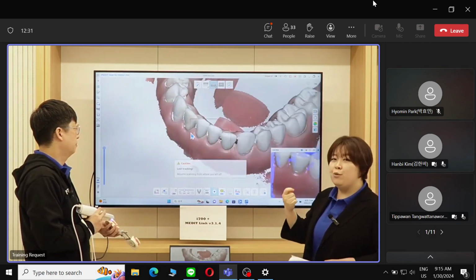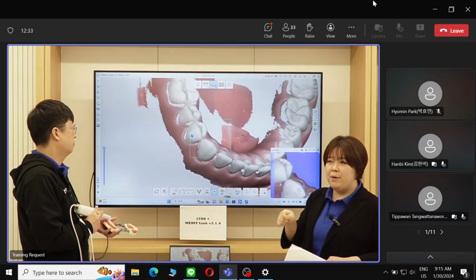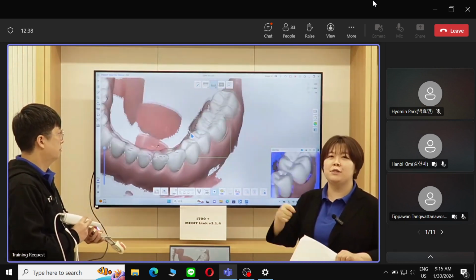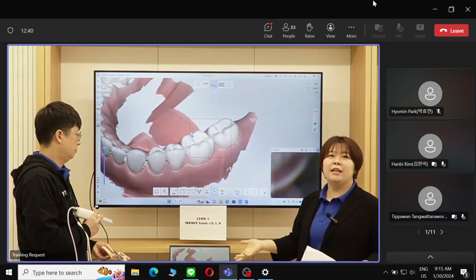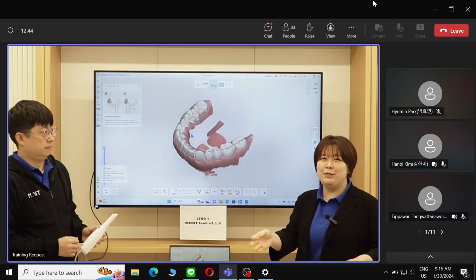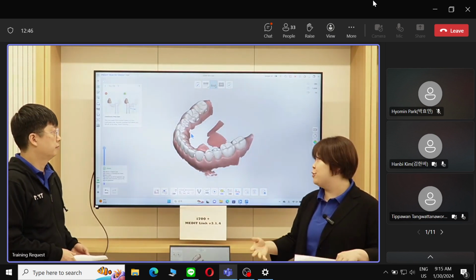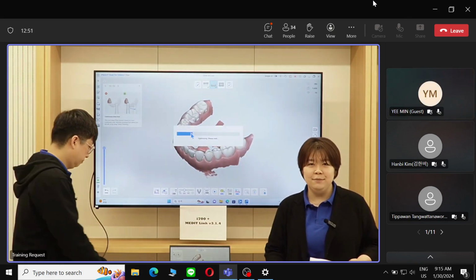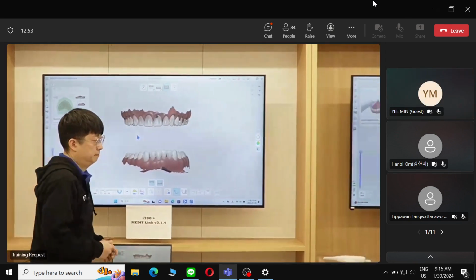sometimes on the screen you would not feel it, so you would still be wondering, oh, maybe I'm still in the wrong spot, and try to move here and there, and so the interruption would continue. Sometimes, like I said, if you're an experienced person, that wouldn't happen, but with beginner users, that was the case. So in the newest MEDIT Link version, this has been improved.